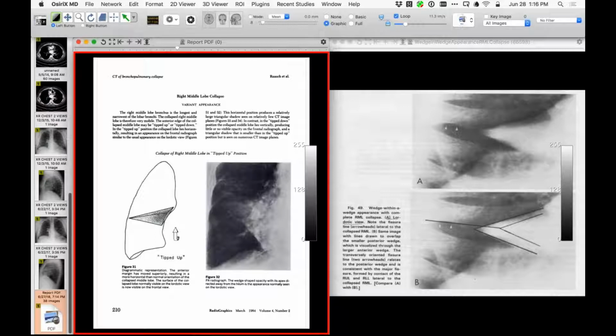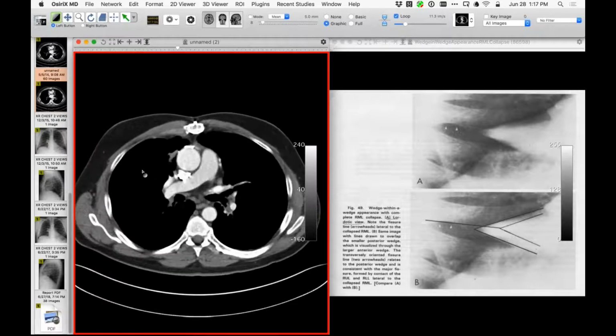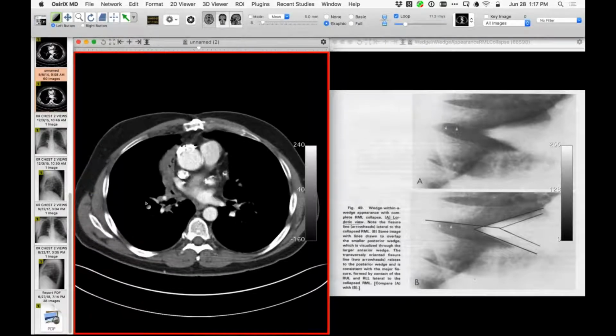In this person, this is a chronic thing. It was thought to be due to perhaps aspergillus or ABPA. I'm not really sure, but this is not obstructive atelectasis, but some form of cicatrization atelectasis. Oh, I didn't show you the right middle lobe properly, but there it is here. And the bronchi here are patent, maybe a bit narrowed, but there's chronic right middle lobe atelectasis there on that frontal projection right there, making up this appearance.